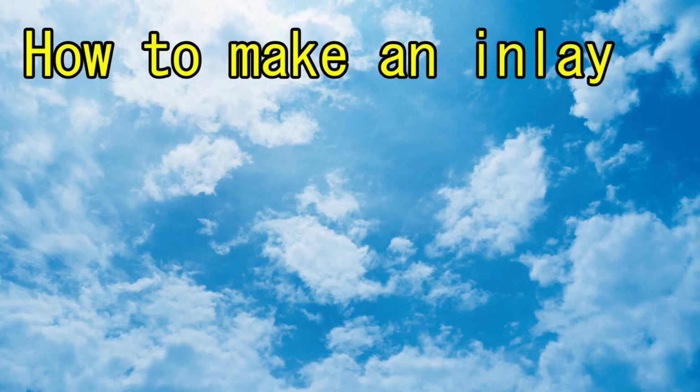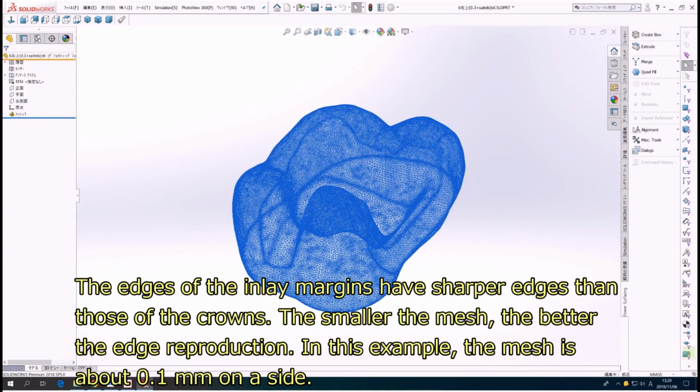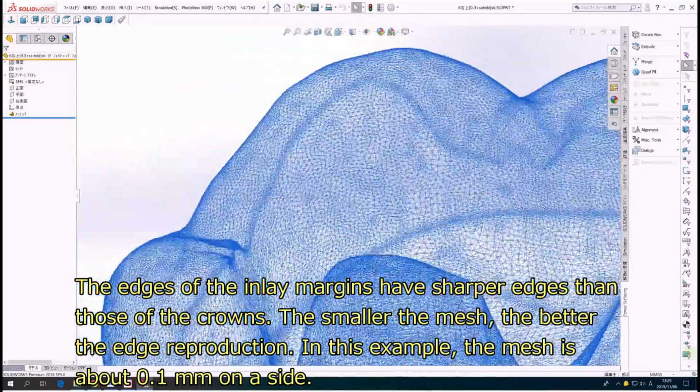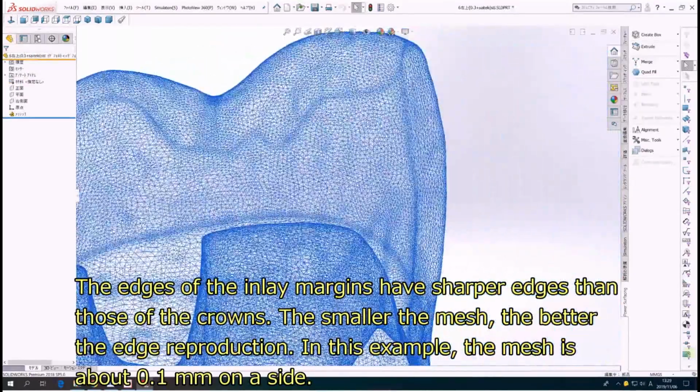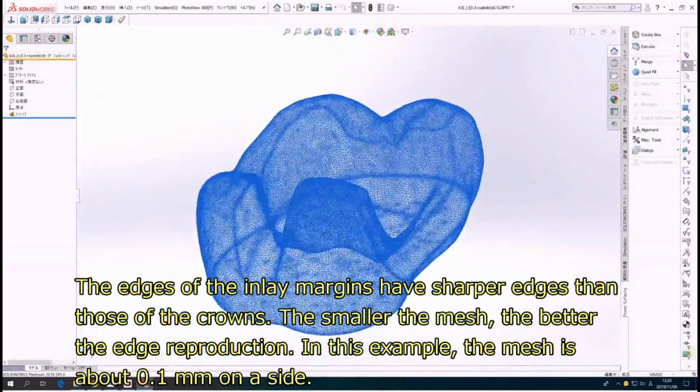How to make an inlay. The edges of the inlay margins have sharper edges than those of the crowns. The smaller the mesh, the better the edge reproduction. In this example, the mesh is about 0.1 mm on a side.